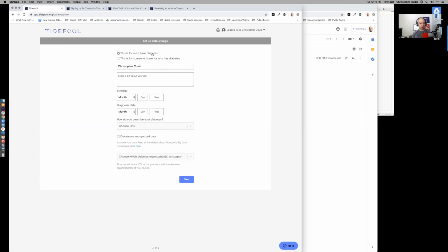For me, I'm going to just go ahead and figure this out. This is for a webinar. I will indicate my birthday. Let's just pick a day. How about this one? Diagnosis day. Again, for the sake of this demo, it doesn't necessarily matter. So we will say here, you have the option to self-indicate what type of diabetes you have. For me, I'll just indicate my type 1.